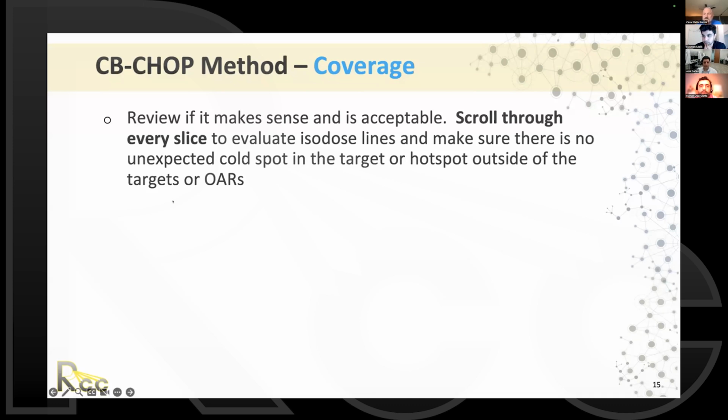Excellent. Two comments I wanted to add as well on this topic. One of them is around this concept of scrolling through to really see the variation from slice to slice potentially in the clinical target volume. Where Dr. Malik and I trained at Princess Margaret, the group is very meticulous about the contours being anatomically precise and smooth in 3 dimensions. When you look on coronal or sagittal, sometimes you may see some contouring where there can be this Christmas tree effect, where it can come in and out a little bit.